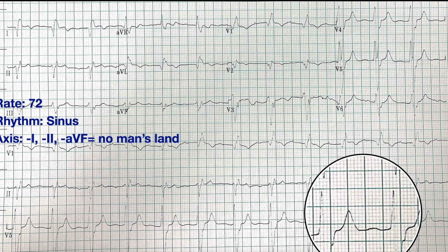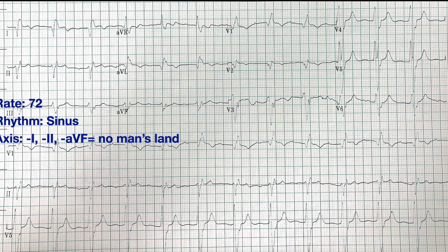So we said we've got probably a first degree AV block, or a long PR interval, if nothing else, and that looks consistent. We've got a wide complex QRS and a normal QT interval, at least we think. And I kind of gave you the next part: rate, rhythm, axis, intervals, blocks. Let's look at the different blocks.